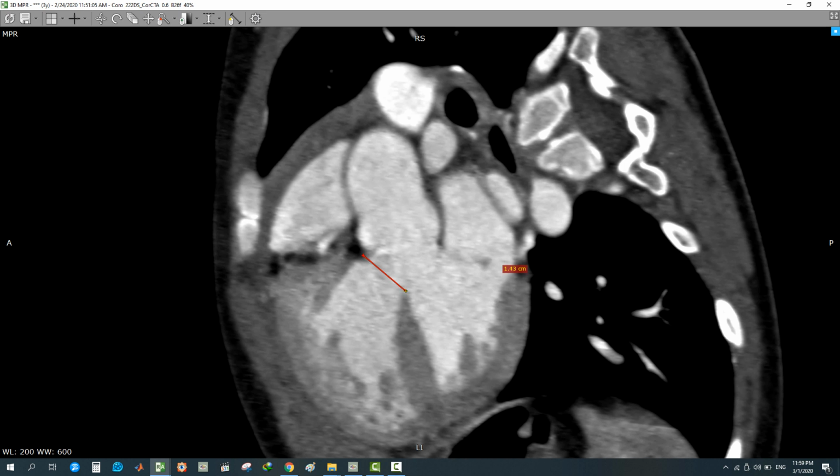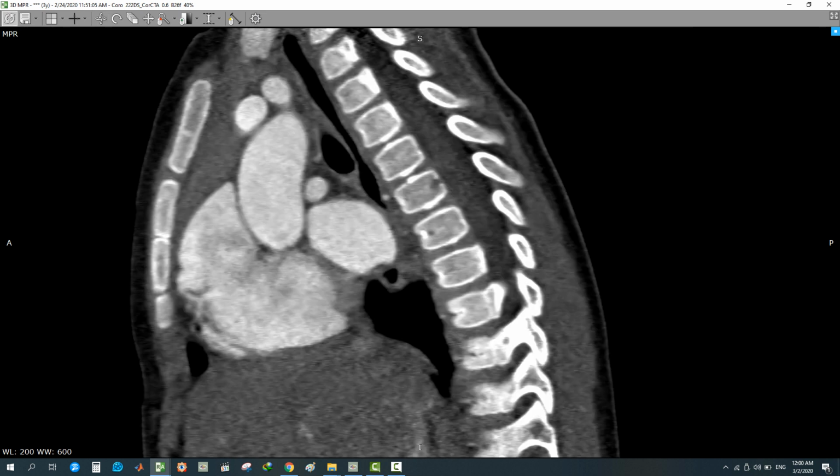Okay, and if you bring a line like this from this to this point, it will be the same as this distance, or nearly the same. So it is the aorta overrides both ventricles 50-50. Okay, this view can easily demonstrate VSD with an overriding aorta. Again, how to get it?